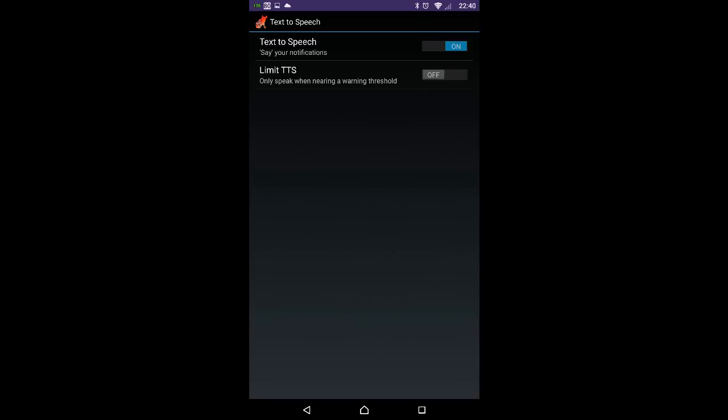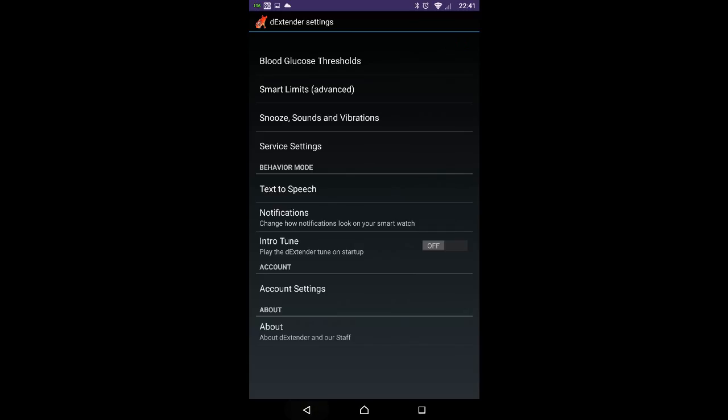Let's just leave this at the text to speech, where I can say only speak when I'm approaching things like between 15 points of a threshold, then start speaking. But let me leave that for now.